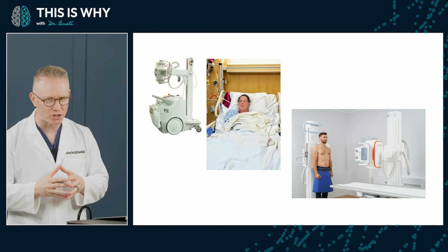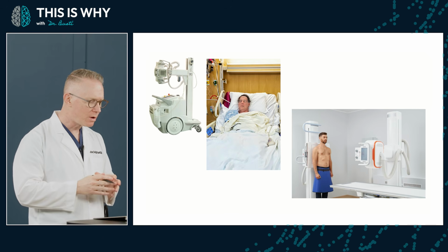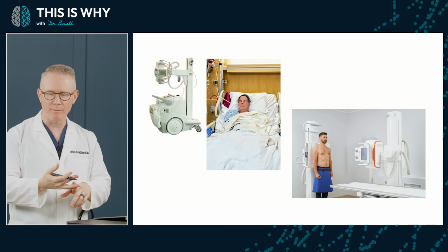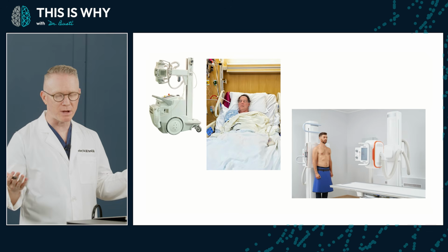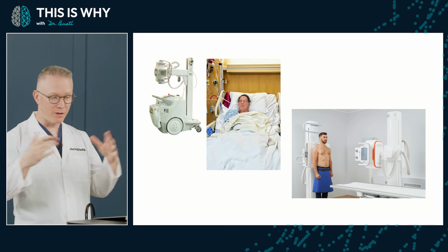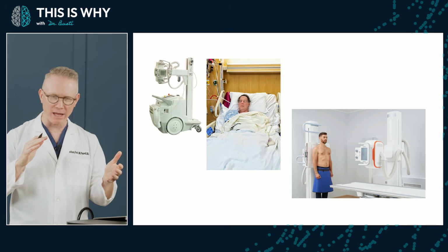So this is about projection. Is it a posterior anterior view or an anterior posterior view? Well, obviously if the patient is lying in their bed, so they're in the emergency department, or in a hospital internal medicine floor or unit, or they're in the ICU, sometimes possibly on a ventilator, right? They're going to potentially be supine or semi-erect. And they've got other things in their bed, right? And their posture, which becomes very important to understanding the positioning of the patient.